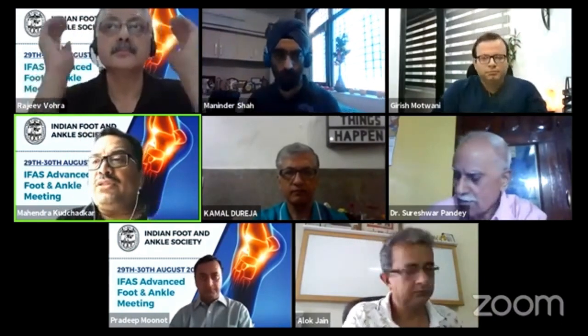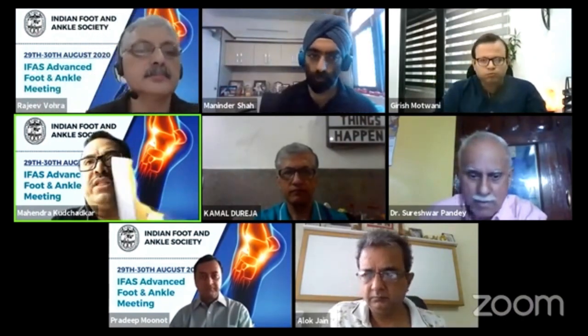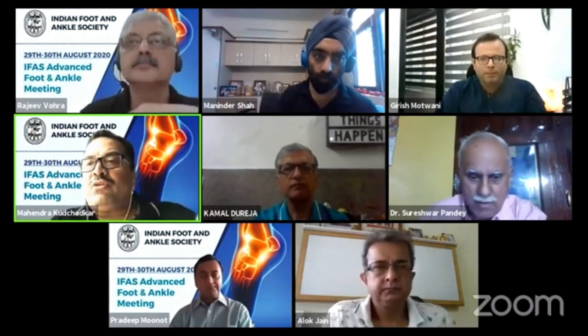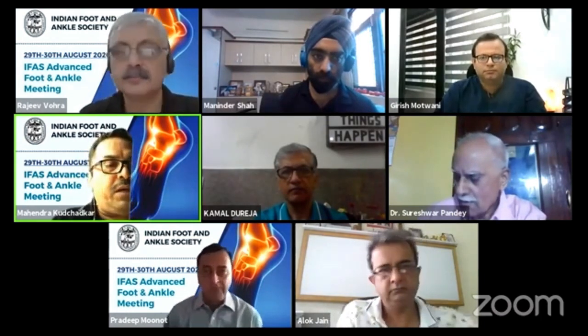And before saying it is normal, I think it's very important to also do, as Dr. Girish has said, these dynamic views, the stress views, because in a static view, you may miss the lesion, especially in a trauma situation. The instabilities may be missed. So it is very important to do the dynamic views.